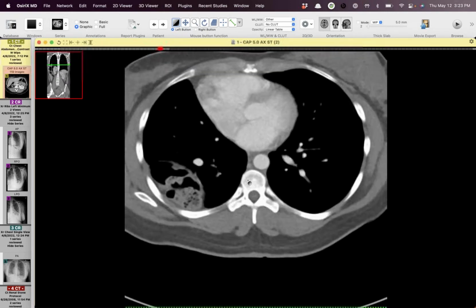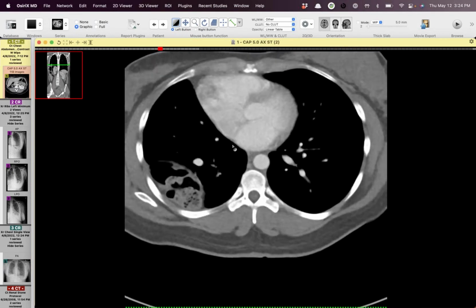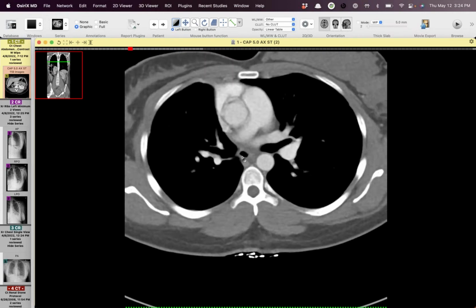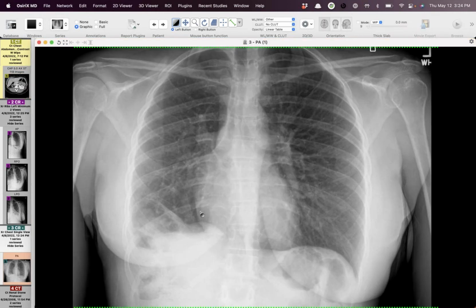Yep. Nice. So there's still one pulmonary vein that drains normally into the left atrium. I don't see a big atrial septal defect, and it certainly doesn't look like she had shunt vascularity. But it was a really good observation on the radiograph. Yeah, no kidding, it would be easy to just say, oh, traumatic hernia, next case.